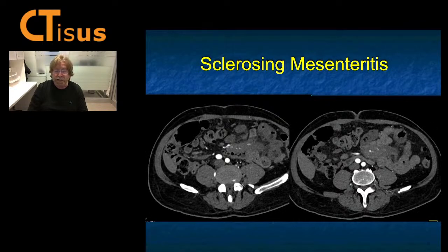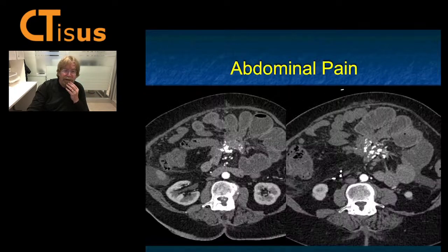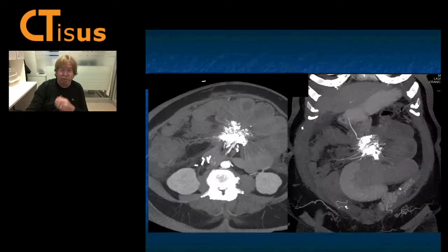Mass-like infiltration in the mesentery is an inflammatory type process. It's benign. Patients can have lots of symptoms because of the encasement. You can get bowel obstruction, vessel narrowing, and ischemia. Wonderful case. Now, sclerosing mesenteritis commonly calcifies, and so does carcinoid, both in the 70% range, so that may not be that helpful. Here's another case, dilated bowel, this encasement, and calcification, which is really, really, really coarse.